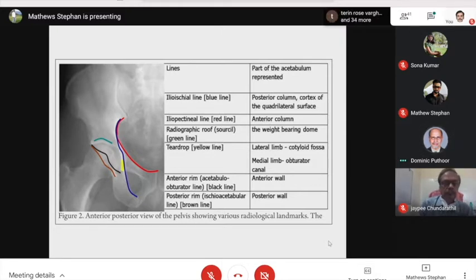Dijo, are you hearing? Because these are technical aspects, the anteversion and all the placement are very difficult to assess. I personally cannot clearly say anything about that. It is very important in the replacement, as Jayprakash said. Now we are dealing with a dual mobility femoral head. That has solved some other problem.